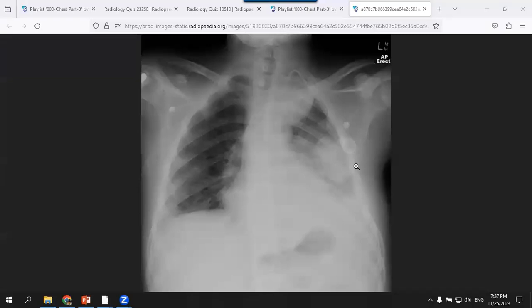So what name of this metastasis? What term? Pleural-based metastasis, maybe? No, with this size, I mean the size of this metastasis. Cannonball. I thought it was usually bilateral and multiple. I'm here only seeing two lesions. Yes, it's still very large. Any clue about the primary in the film?